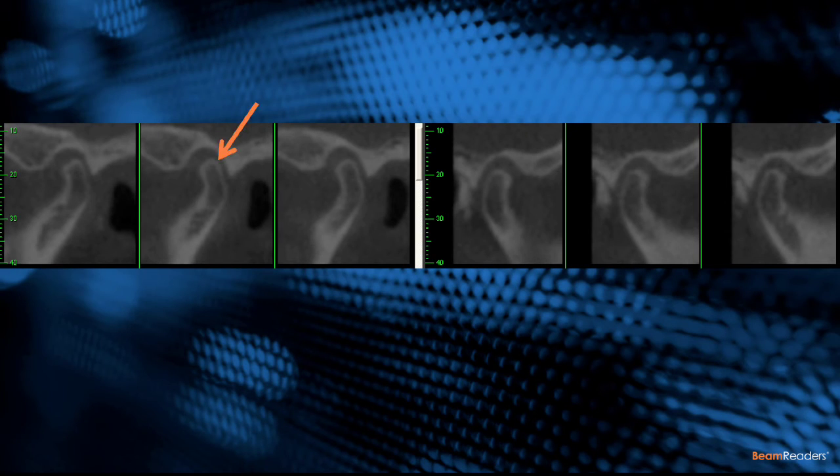Again, if the chin is too far back, you'll also notice that the condyles are placed posteriorly in the fossa. And what we'd like to see is the condyle centered in the fossa. And this is obviously not the case here. Now, if this were a true anatomic relationship, we would think that this is a risk factor for anterior disc displacement rather than a positioning error.